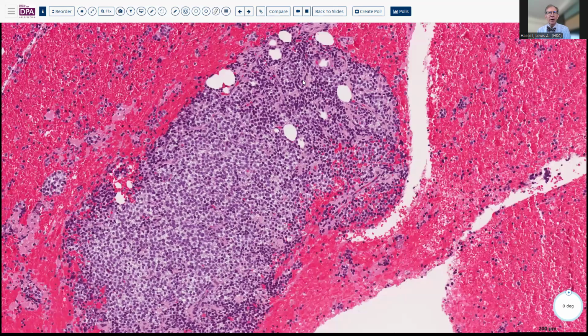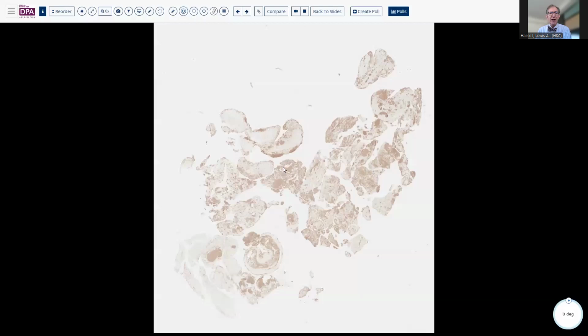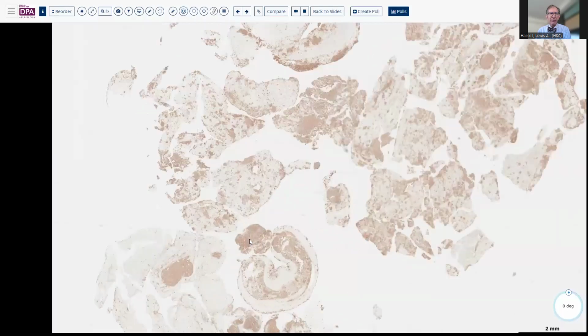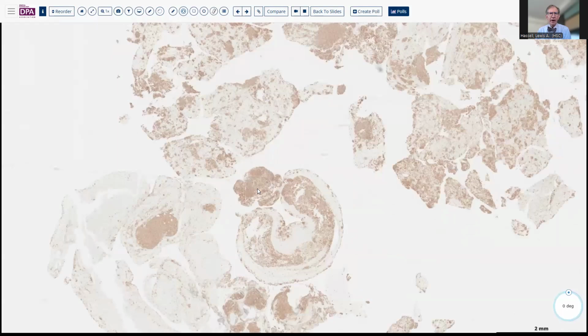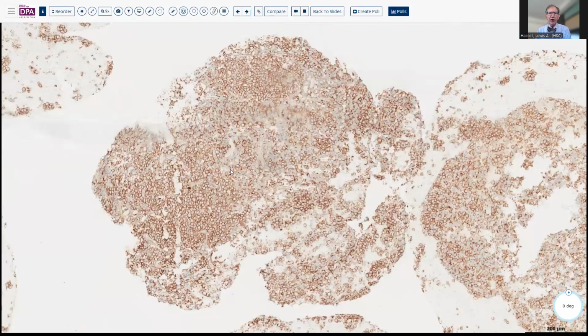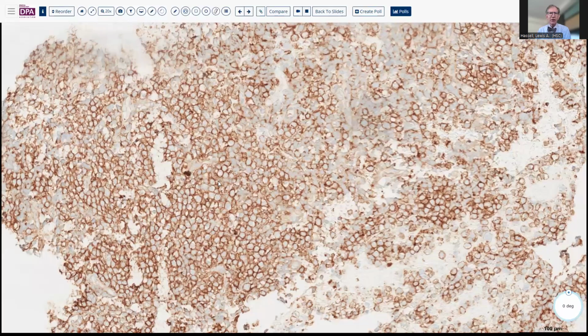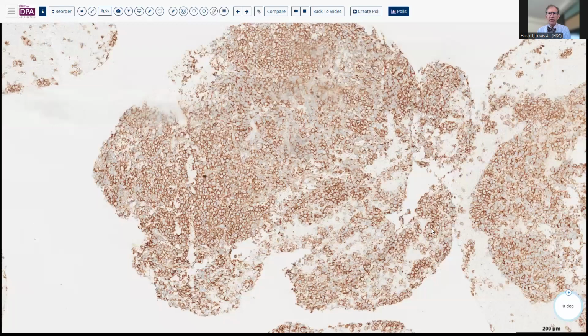So that leads us to go after some immunohistochemistries, which may be pertinent to narrowing that differential. CD45 was done, which was negative, and CD99 was performed, which was positive, which puts us into the category of Ewing sarcoma, as well as a few other sarcomas that can be positive with this. As you see here, very nice strongly membranous and slight cytoplasmic positivity with the CD99 marker in this case.